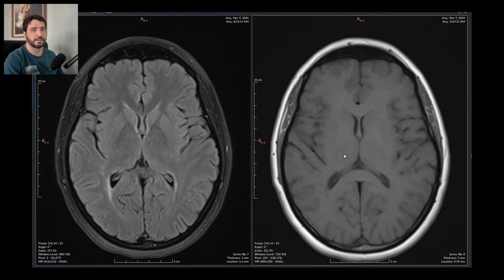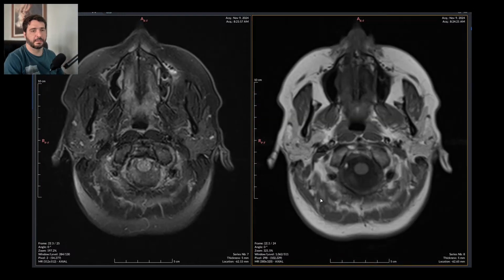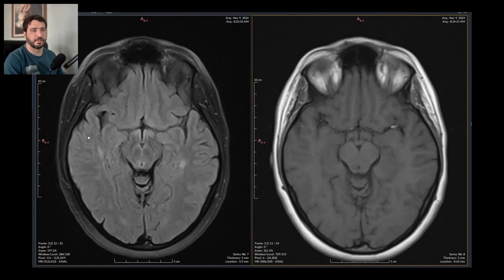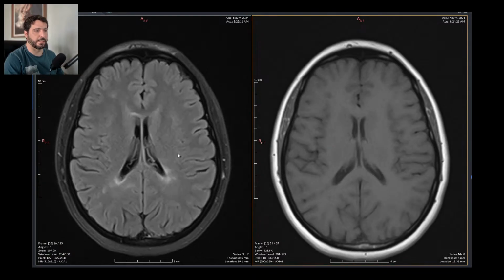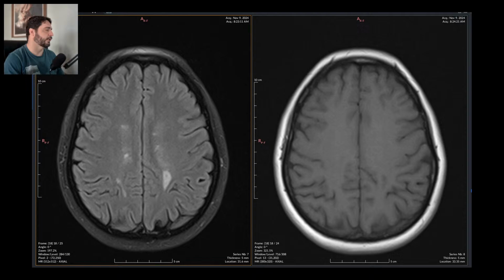This T1 is definitive disease right there and right there, and the FLAIR is less definitive. The bright spots on FLAIR usually are surrounding a definitive lesion, a cavity, a malacic site right there, there, and this is Fazekas 2 because there are small but confluent lesions.